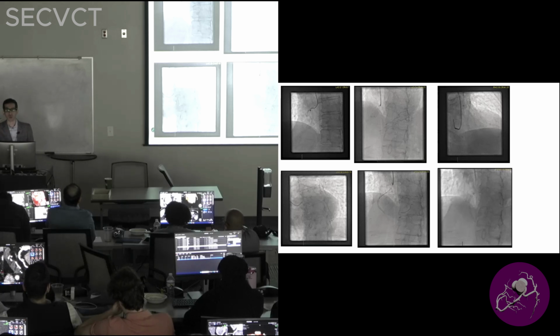And again, try to understand the lesions across the artery. Don't take an absolute value, i.e., apical LAD. A lot of the time, for mild to moderate disease across the LAD, it's going to get to 0.74, 0.75. So try to understand if there is a focal lesion with a significant drop in the CT-FFR.